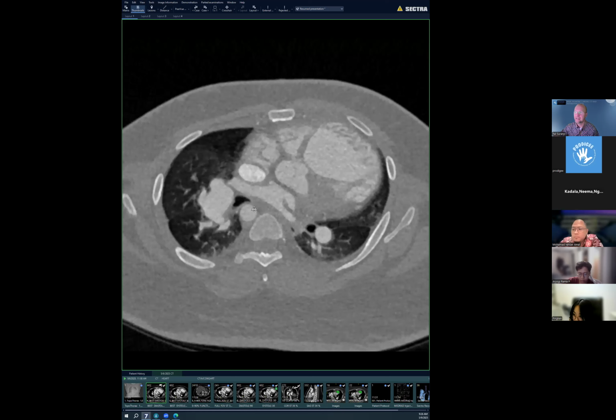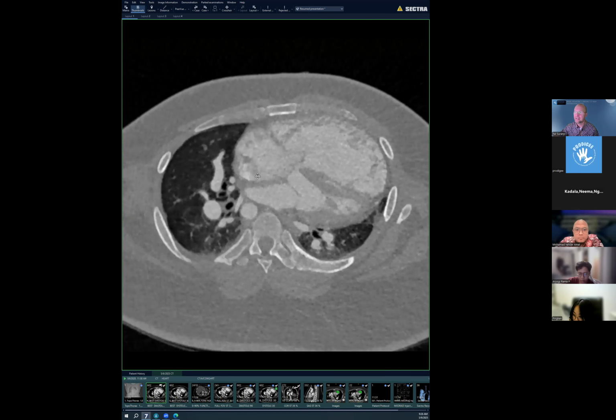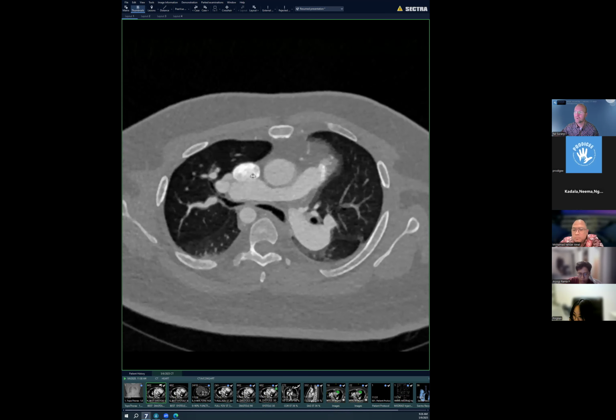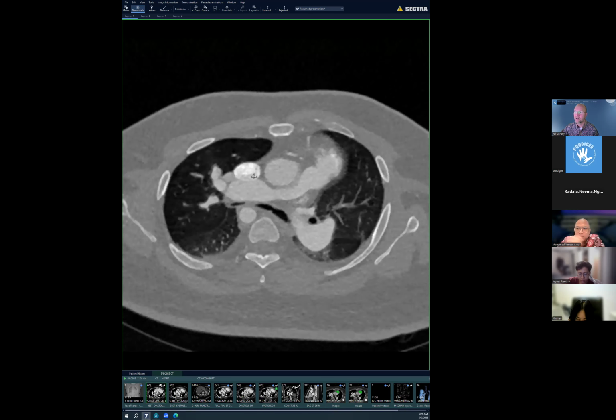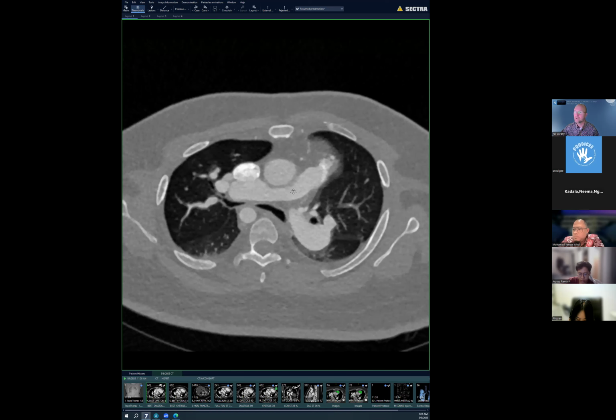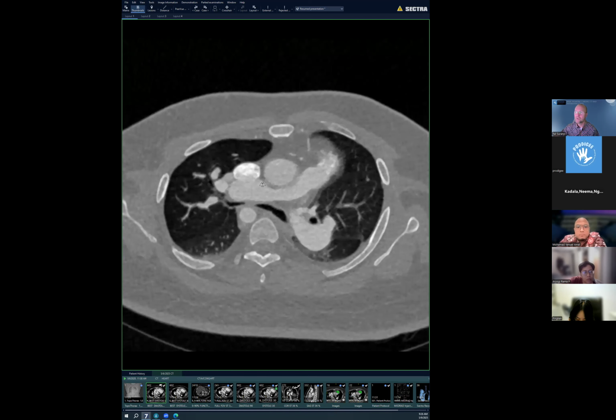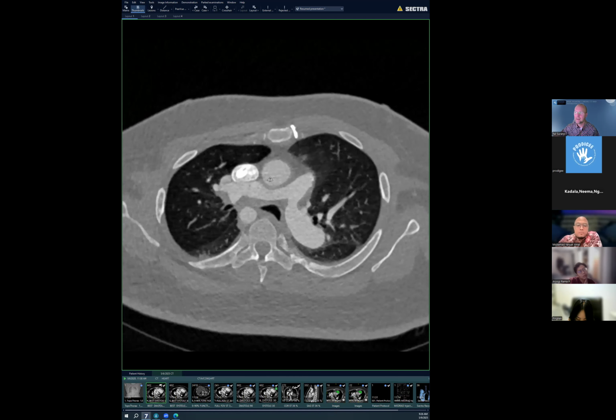And then bronchus intermedius still flat, but then you have the right middle and lower lobe bronchi that are fairly decent in size. And you can see that the compression of that right main bronchus happens right where we see this marked right pulmonary artery enlargement. We can also see moderate narrowing of the proximal right pulmonary artery. So this may actually be a post-stenotic dilation.